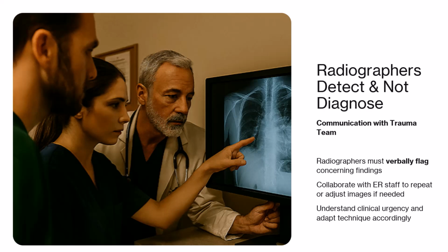Document your observations. Note in the imaging log or the PACS comment field: radiographer observed possible pneumothorax, ER physician notified at 9:12. This protects the patient and the radiographer and ensures continuity of care.